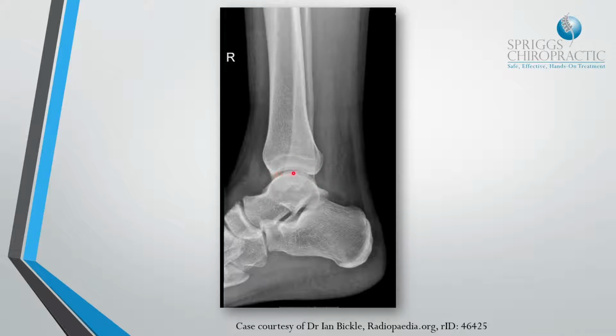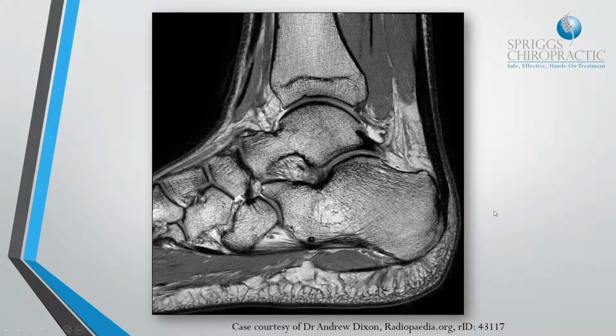So as almost the horizon of the highest point of the dome is observed, it will appear flat from the front, but obviously, like I say, it isn't. It's curving away from you just here. But again, great way for evaluation of the main body of the calcaneus as well, and the head of the talus also comes into a really nice projection as well.